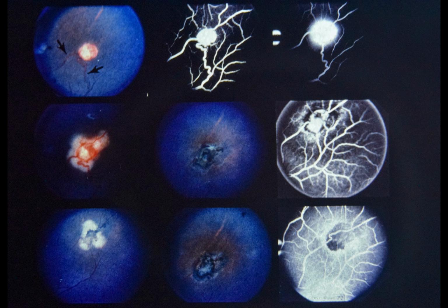Photocoagulation treatment of retinal angioma. This is the left eye of the 21-year-old black female whose right eye was shown in slide 71. Visual acuity was 20/16. Upper left, note isolated retinal angioma with single feeding and draining vessels in supratemporal fundus.